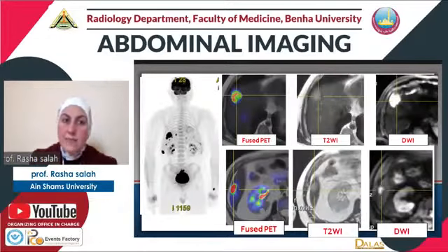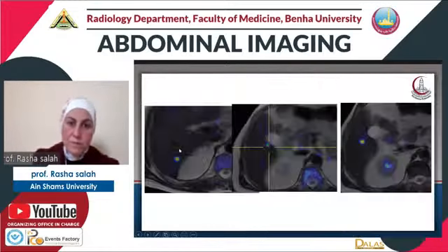For distant metastasis, it is very helpful also in staging for hepatic focal lesion metastasis combined with the MRI components, which is also demonstrated over here on the diffusion weighted image as multiple areas of restricted diffusion. And this is the map image demonstrating the exact heavy metastatic load within the liver.